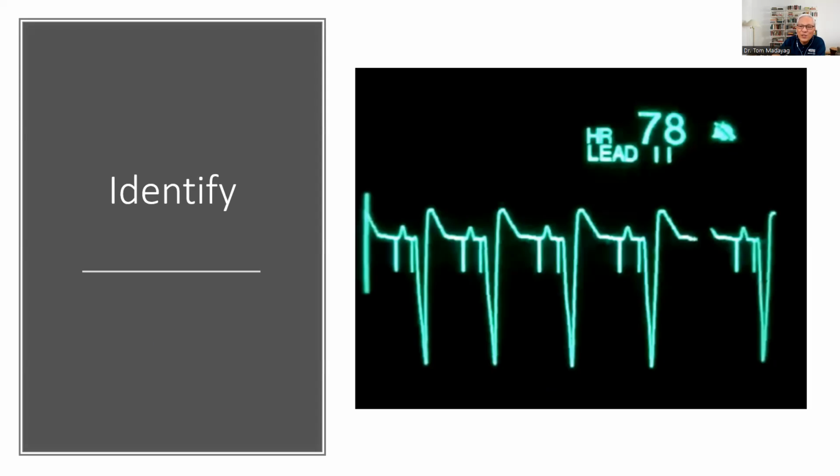All right, any questions? All right, for those of you who missed it, because some of you said ventricular pacemaker only, and some of you answered atrial pacemaker only: if you take a look right over here, you have a pacing spike, and that pacing spike is followed by a P wave. So we know that there is an atrial pacemaker. At the same time, there's also a spike right over here, which causes the QRS complex. Therefore, this also indicates the presence of a ventricular pacemaker.